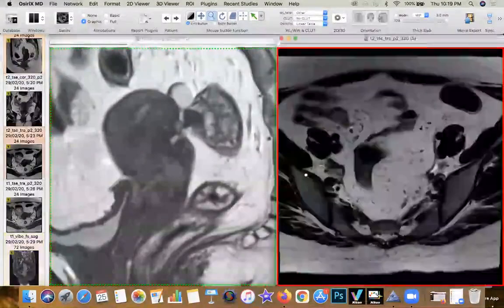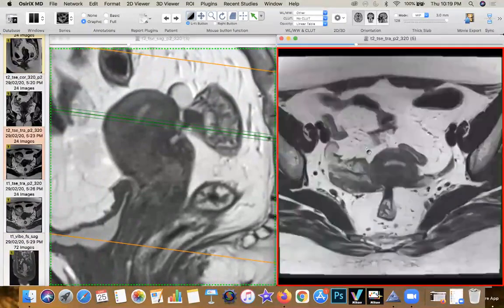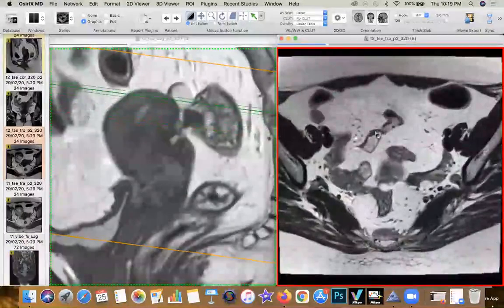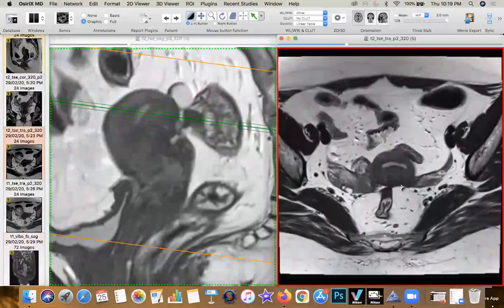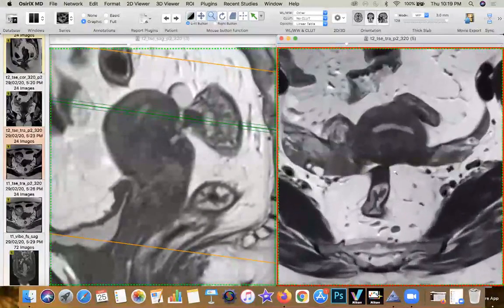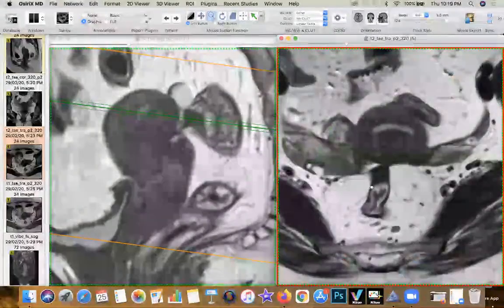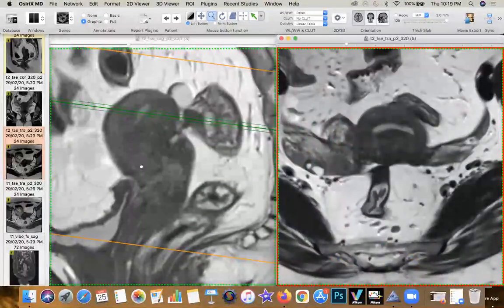And secondly, what else do you have? You have both ovaries, which are now not ectopically located within the pelvis or above it, but both are located in the parauterine space. And you can see this beautiful plastering, what I call adhesions, and the frozen pelvis, which you can see in this location. This is a classic DIE mid-cul-de-sac pattern, frozen pelvis, rectal wall invasion.